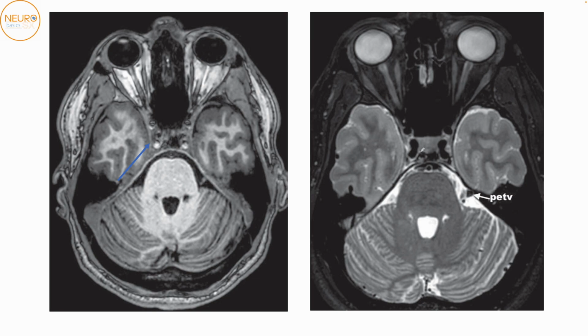Okay, so here now we're able to make out much more clearly the cavernous sinus located over here, as we go further down. And within the cavernous sinus, there's this very obvious T2 hypointense structure that is the cavernous ICA located over here. Okay, you could very easily identify that this is the pons because it forms a bridge. So it'll always have a full connection with the cerebellum.